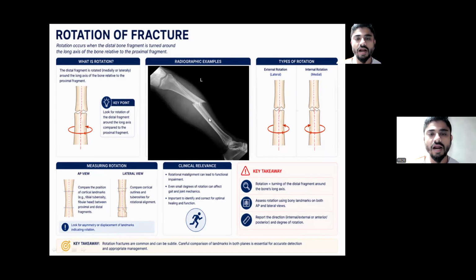Okay, so this is a lateral rotational injury. Lateral rotation, you have to mention in terms of the distal fragment, the distal bony segment. Now if you concentrate at the level of the knee joint, it looks like the exposure is taken in the frontal projection, right? So this is a frontal projection. As we go down, you should be seeing tibia and fibula separately, or there might be slight overlapping. Up to this part, the normal alignment is well maintained between tibia and fibula.